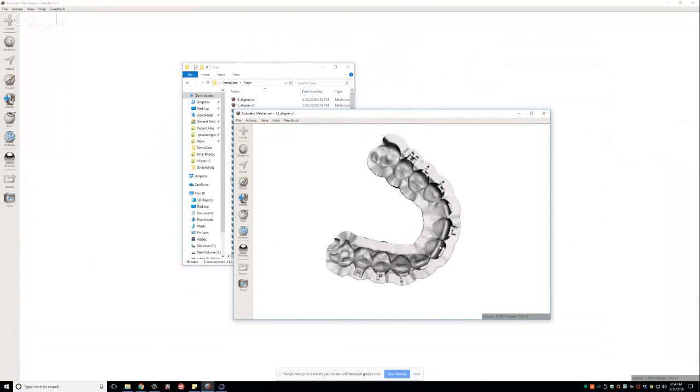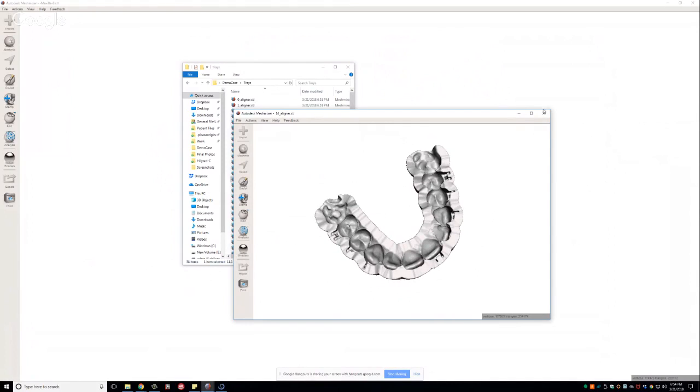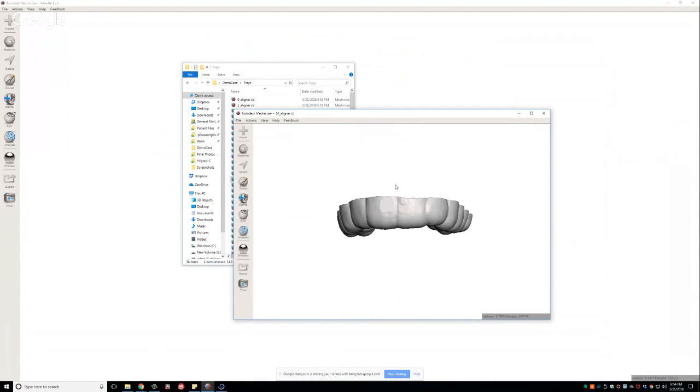So here's what the bracket tray looks like. And so you can slide the brackets in. I recommend printing this in Ortho IBT resin. It is a clear, flexible resin. It's great because you can cure through it, but also it's flexible, so it peels off very easily, and I don't segment it a lot. The traditional way to do IBT trays is to segment either in quadrants or sectants, but I actually can peel the entire thing off at one time.